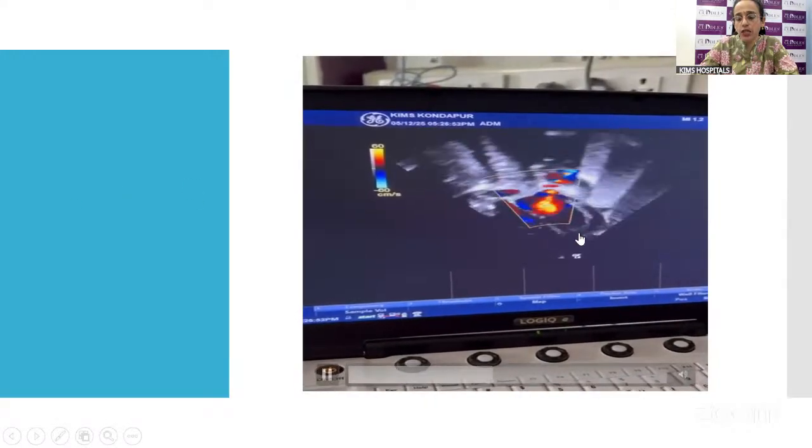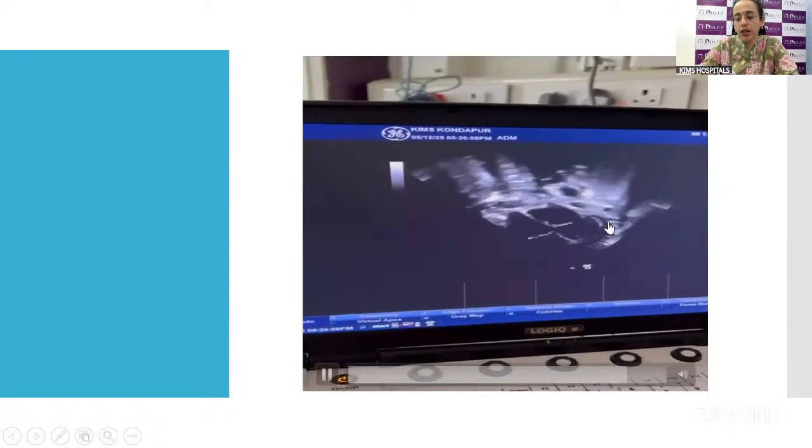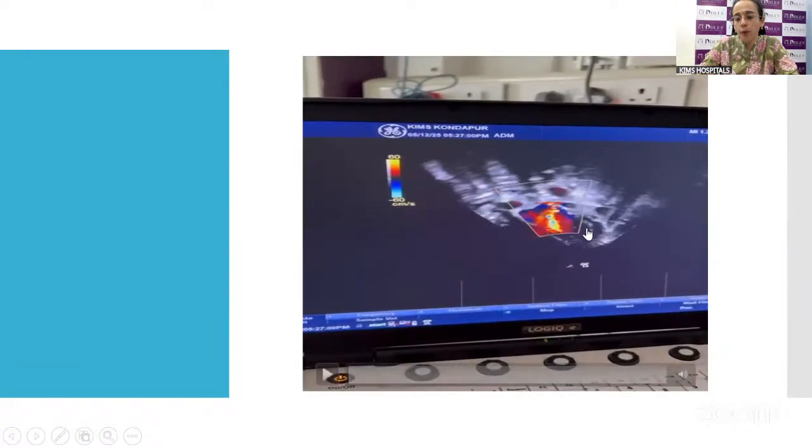pericardial effusion. Here you can see the border of the heart, and surrounding the border you can see some space where there is the effusion. Normally this gap is not seen separately. In the four chamber view of the heart, just outside the left ventricle, you can see some hypoechoic area where the pericardial fluid has accumulated. If it is in the severe category, like going into cardiac tamponade, we have to drain the pericardial fluid so that the baby's distress, desaturation, and shock will come down.